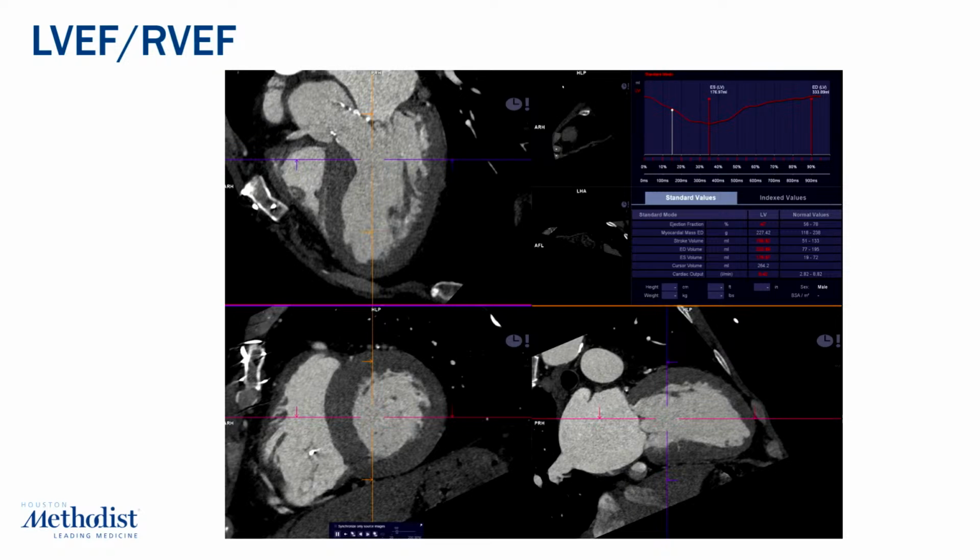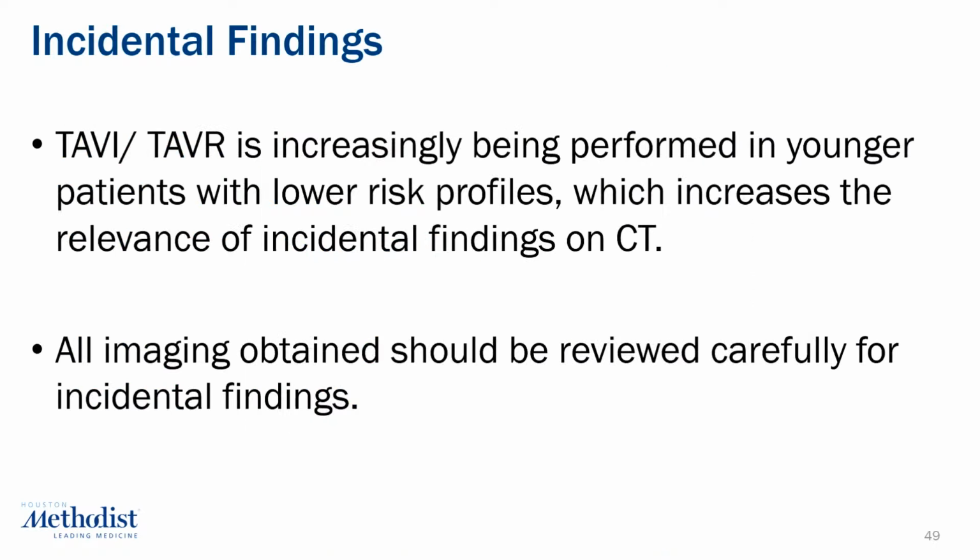Sometimes it's just an issue with the contours, so you want to go back and make sure that the contours, just like you would do with MRI, stacks in short axis, you want to make sure that the contour is properly aligned, so you get all the right measurements.